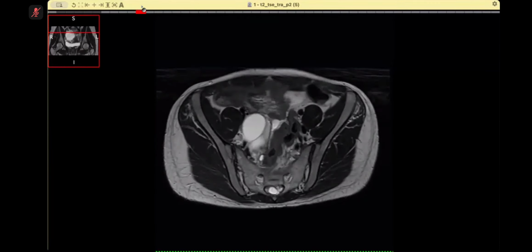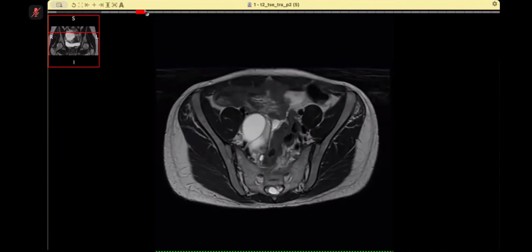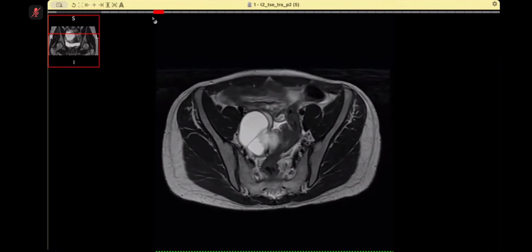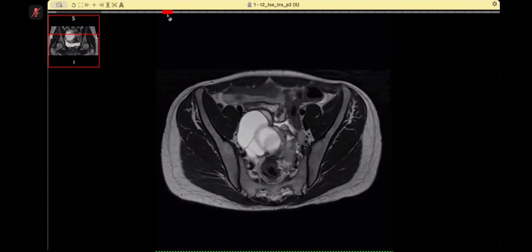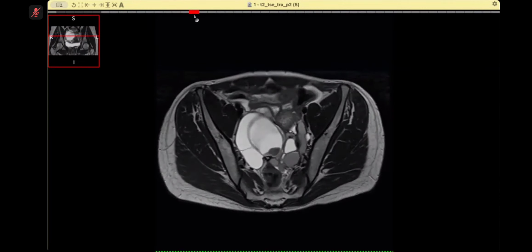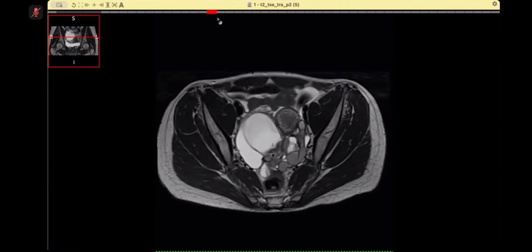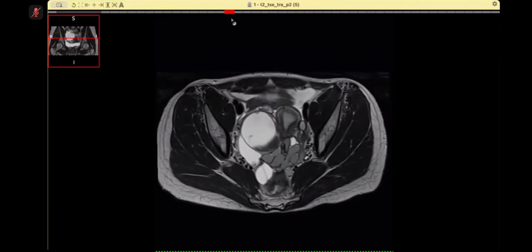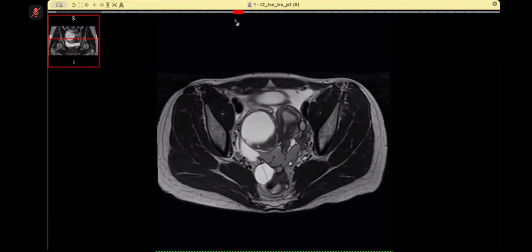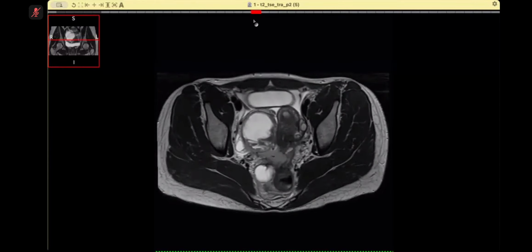I would also like to review this on the coronal images as well, because this cystic area shows a tubular configuration with the internal septation, could be fallopian tube with fluid noted in it, and the other rounded lesion with this eccentric low T2 signal intensity area may represent endometriotic cyst. And I would like to see the coronal images.